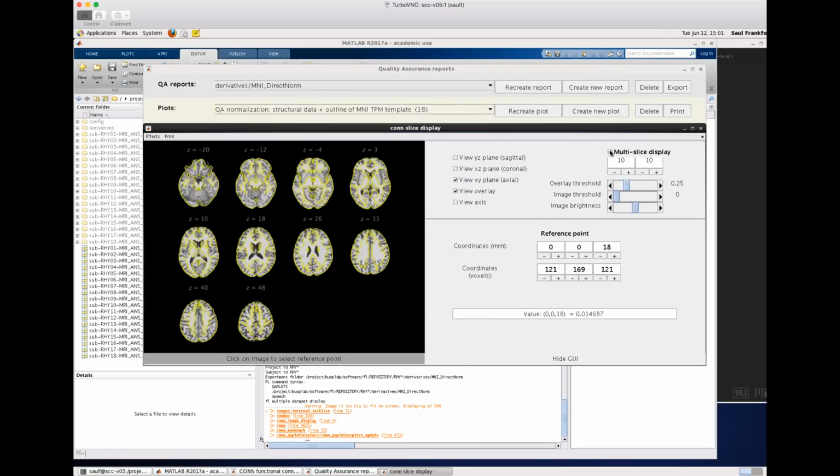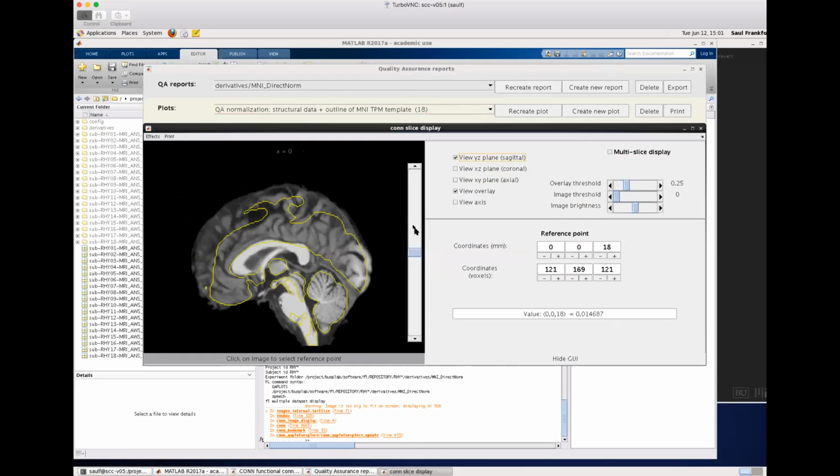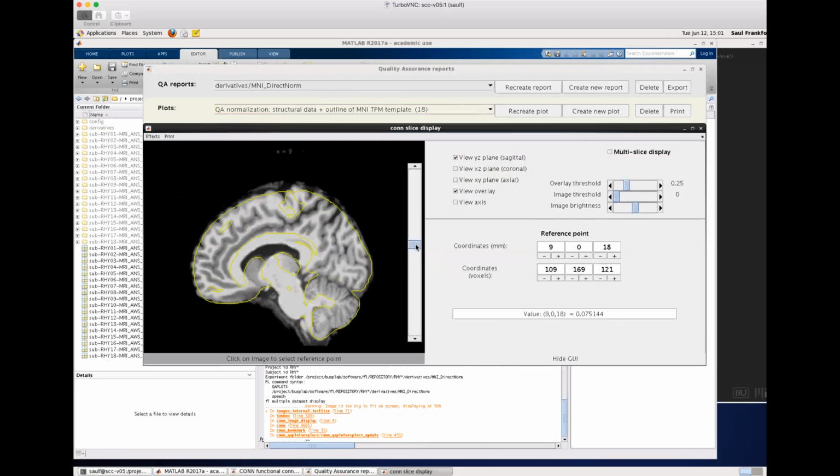Yeah, these are the things that I typically just generate like a PDF file, and then I take it with me to have a coffee and go browse over every subject quickly just to make sure that I'm not missing anything obvious in those plots, because there are many plots to look at, and clicking through all of them is a little bit cumbersome. But it's good to at least browse quickly through the plots, and then go in more detail through this procedure for the subjects that you find are perhaps problematic because of the histograms, the same thing that we're doing here.